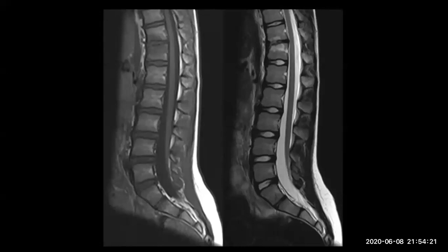About 16, 17, yeah. Adolescent. Doctor, how do you know the main key for this from the far? We know the age of the patient before, actually. If not, from the image, we don't know from the image. But there is a clue here. What is the clue here?